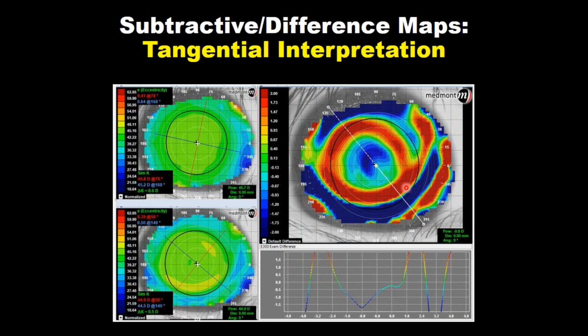We've got the blue ring, which is where the landing zone angle of the CRT comes down and touches the surface, creating a flattening on the epithelial tissue, and that's slightly inside the pupil, whereas it's about a 0.5 millimeter above up here. We could also say that the ring appears to be more temporal of the pupil, so look at the distance the ring is inside the pupil here versus outside the pupil there.